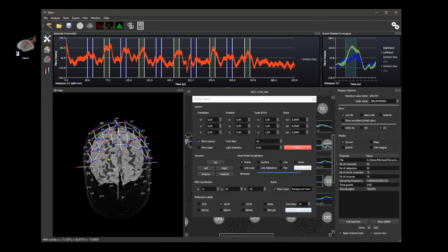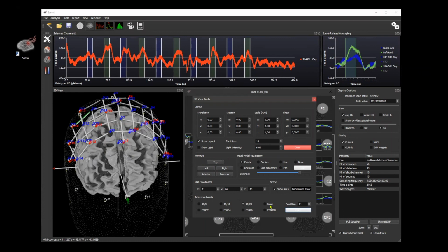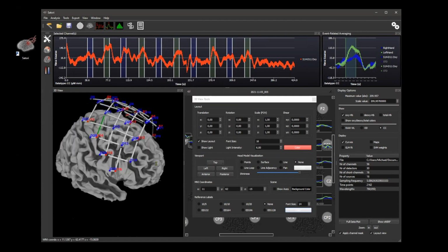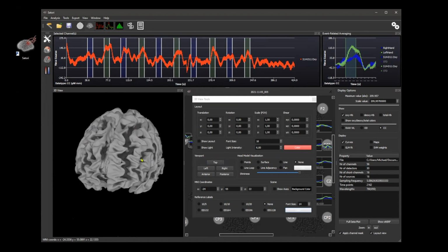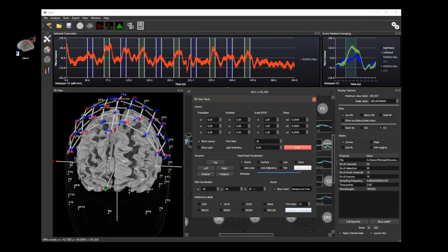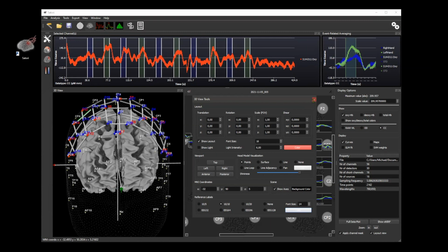And you have different reference labels. So currently it's the 1010. We can also switch to 1020 or none of these. So the view of the data, you can change. You can completely show only the brain, for example. Now this is up to you how you want to basically present your data and point it out later on, but this becomes more interesting when we do the analysis.